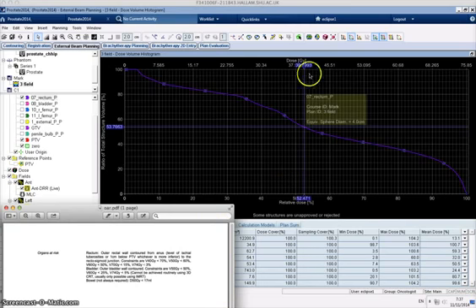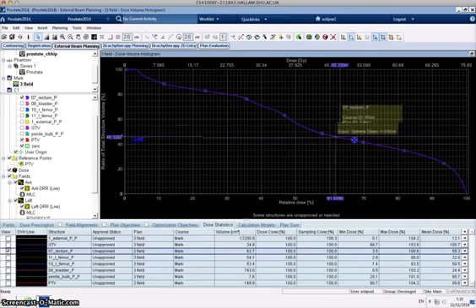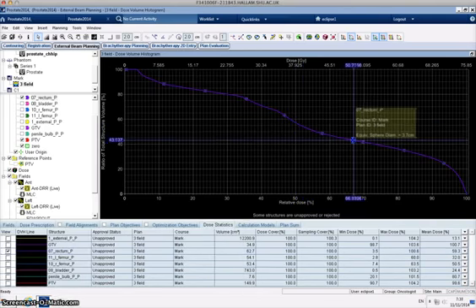So if we bring that back up again, so there's 40 grey there, so across, and 53, so we can see that we're getting 53%, so that's less than 70%, so we're happy with that. And let's just look at the other one in order to just show you again. So V50 less than 60, so I'm going to get my crosshair, go down to where 50 is, again that's about there, and we can just tweak that.